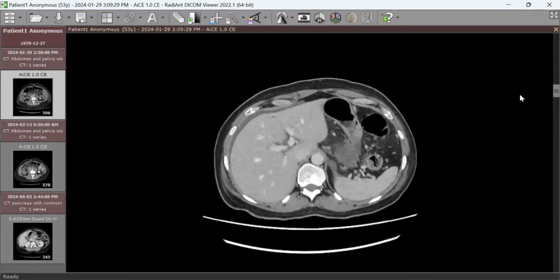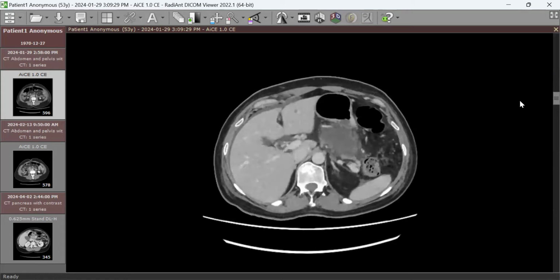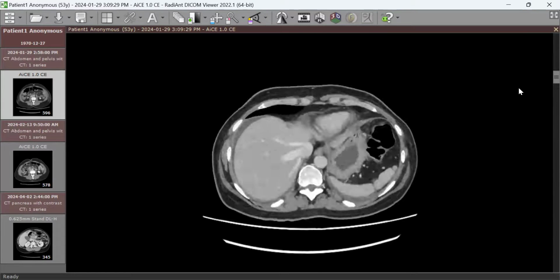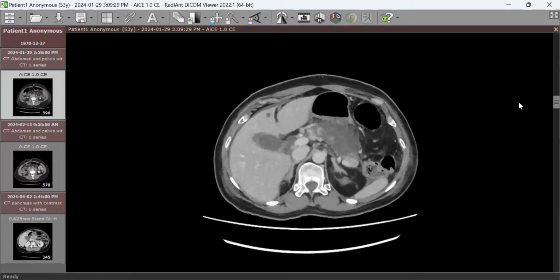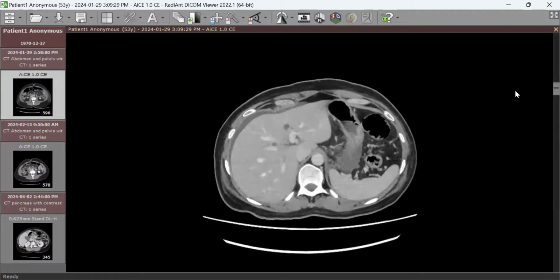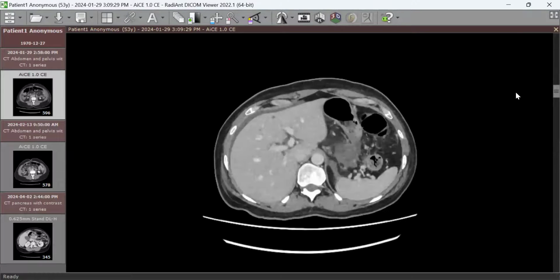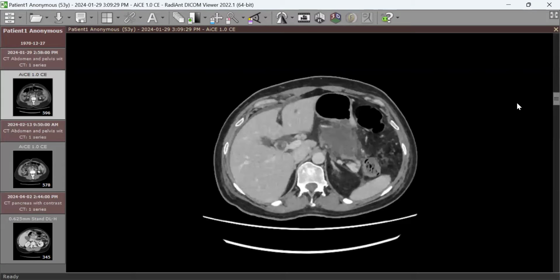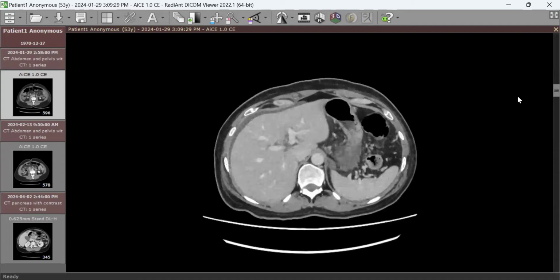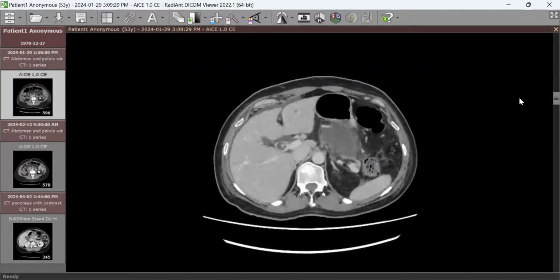How do you differentiate between periportal edema and intrahepatic biliary dilatation? Intrahepatic biliary dilatation is continuous to the periphery of the liver. Okay, follow this. Obviously, we have multiple hypodense focal lesions, multiple scattered through the liver, on the right. So what do you think? Is it mild intrahepatic biliary dilatation or periportal edema? No, I think it's dilatation.